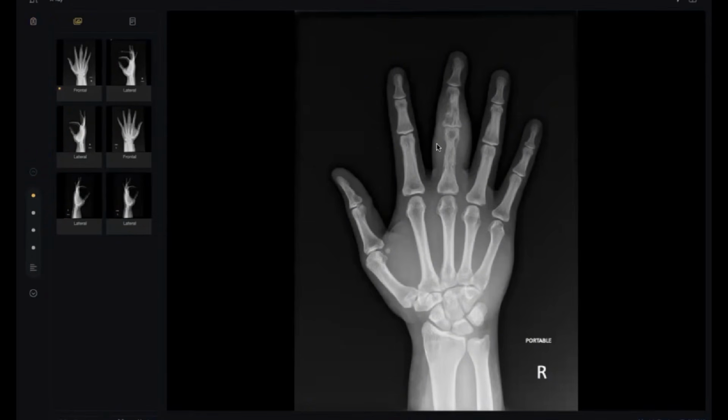I am provided with an X-ray of the hand. There are multiple lytic destructive lesions noted along the proximal and middle phalanx of the middle finger with soft tissue swelling. There is cortical irregularity on the medial and lateral aspect of the proximal and middle phalanx, along with cortical thinning and cortical thickening along the middle phalanx of the ring finger.